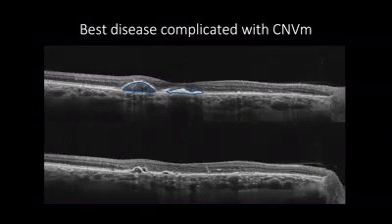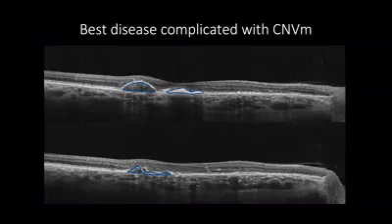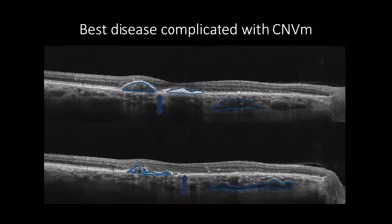Still, in other cross-sections for the same patient, there is a pigment epithelial detachment showing increased reflectivity of proximal membrane, forming double layer sign adjacent to subretinal fluids that indicate an active occult choroidal neovascular membrane. Please note that the choroid is thick with dilated Haller's vessels in both cross-sections, indicating the presence of pachychoroid.